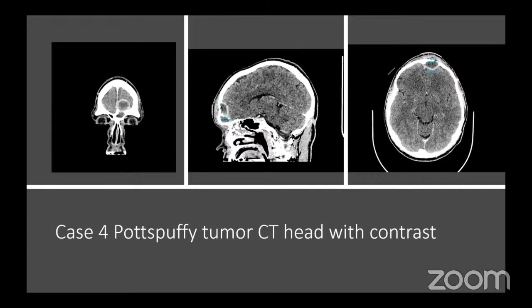So this is a frontal sinusitis complication causing bony complication to both the anterior table and posterior table. This patient was taken to theatre as a combined procedure. My colleague, Mr. Anastasios, neurosurgery colleague, drained the extradural collection, and I carried out frontal trephination, as it was extremely difficult to access the frontal sinus.